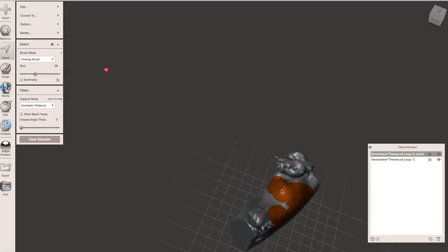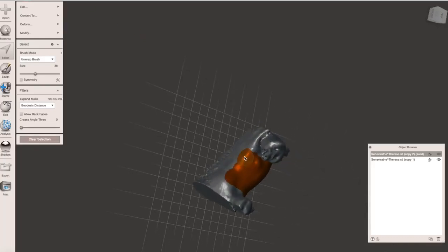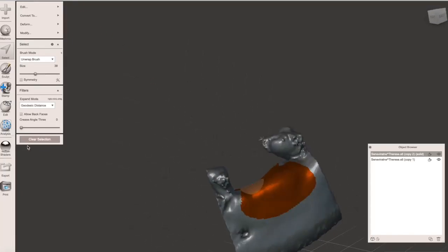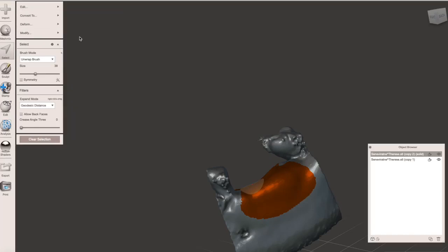One thing that I saw from this case, we had to be careful selecting to make sure that we didn't select too much so that the eventual guide that we'd produced wouldn't fit down into the gap, obviously, and that's just really looking down over the top and visualizing the path of insertion.